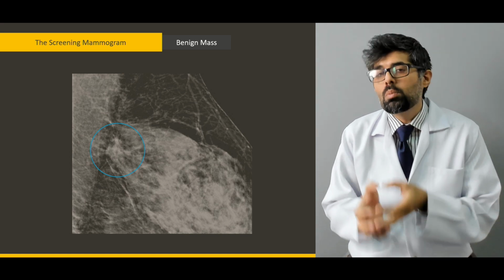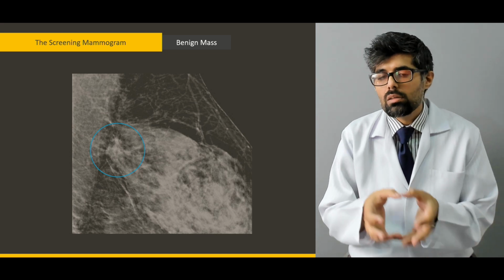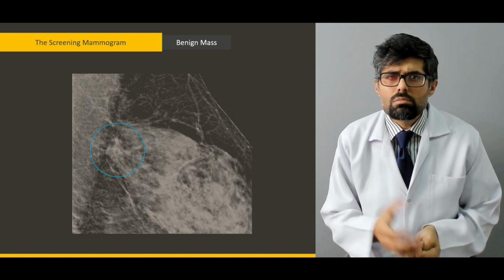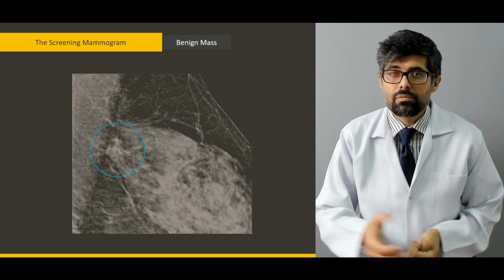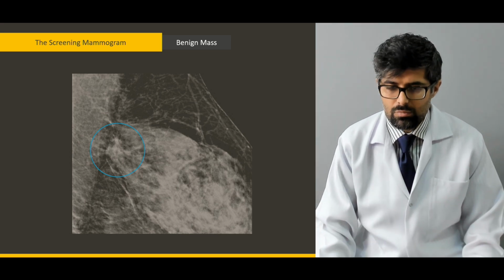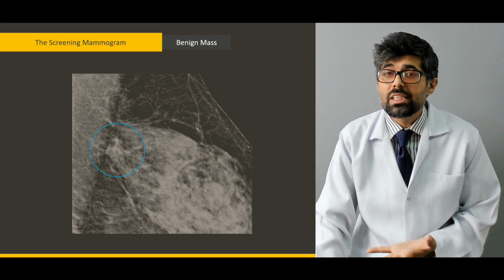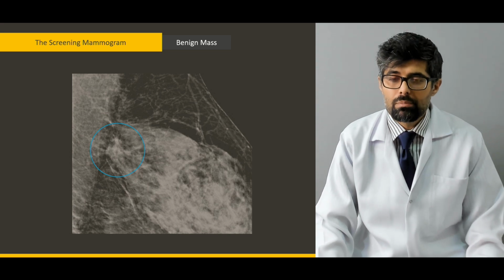So a good doctor must always be on the lookout for these. These are the masses or objects which are usually termed as false negative. These are the ones which I said are not found on the physical exam but may be observed on the mammogram.